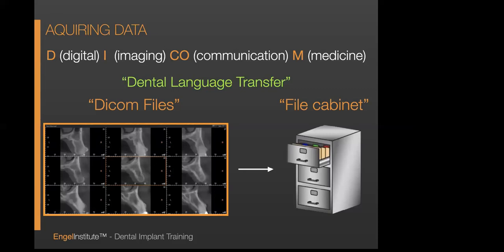Each slice that you're looking at here, you see 9 slices, 3 horizontally and 3 vertically. Each slice is referred to as a .dcm. So if you pick the one in the middle, and we decide that we want to look at the middle square that's highlighted in orange, and we're going to place an implant in that, that is a DICOM file. That is a slice of the jaw in that particular spot. It is a paper thin slice. If you go to the right or go to the left, you are moving a slice in each way. But this is called a set. I refer to it as almost like your file cabinet. You're going to put all these pieces of paper together, and you're going to smush them together, and you're going to store them. That's called a DICOM file, and we'll get back to that later.